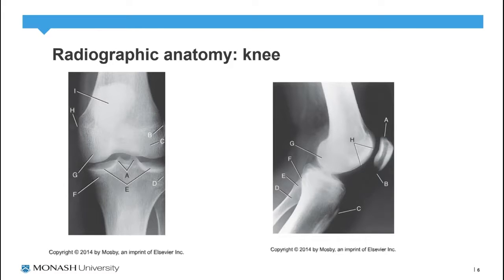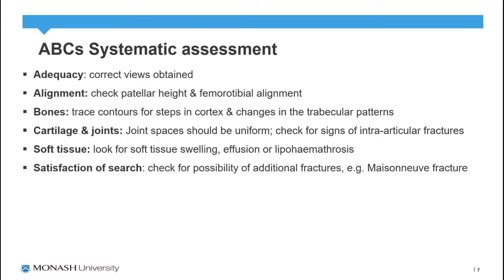I've again included some projections. So there are projections of the knee. I want to encourage you to identify the radiographic anatomy, and I will provide feedback on that when I give you the practice bank feedback.